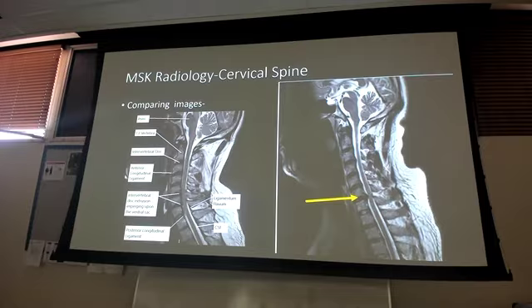Yes, sir? So is it starting higher up too? I can see like right here? Yeah. A little bit, yeah, good eye. So for those that are looking, right, it does look like we might have another small one here. And that small one up there is what I was telling you about, right? That's the one that's not causing any issues. It's barely pressing on the cerebral spinal fluid. It's not touching the spine at all.